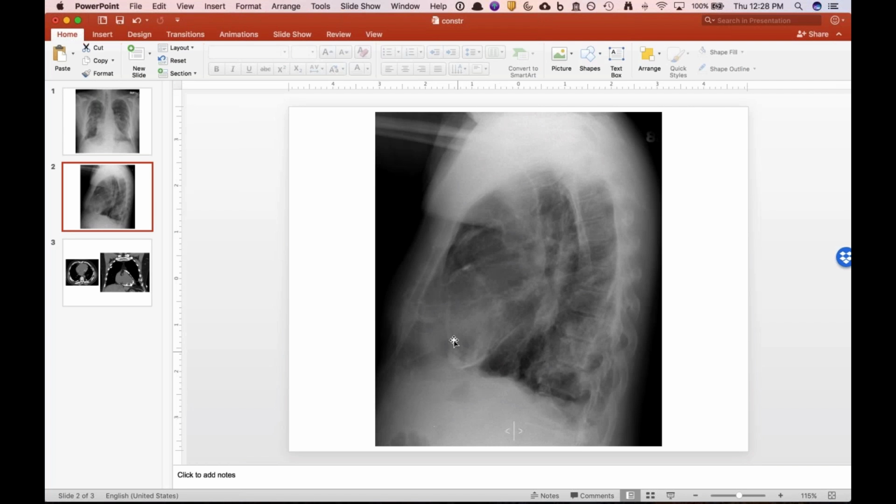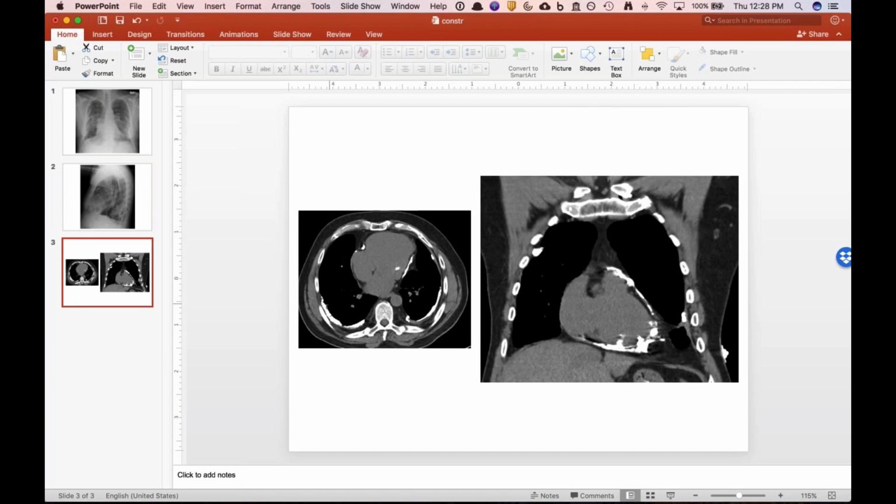And all I have is the PowerPoint images. I don't have the actual study. But this is a patient who had constrictive pericarditis and actually went for stripping. So it wasn't just pleura. And you can see they have pleural plaques, and these look typical of plaques. And so it was presumptive asbestos in the pericardium as well. I don't know if they looked for ferruginous bodies when they did the pericardiectomy or not, but this was the case I was thinking of.